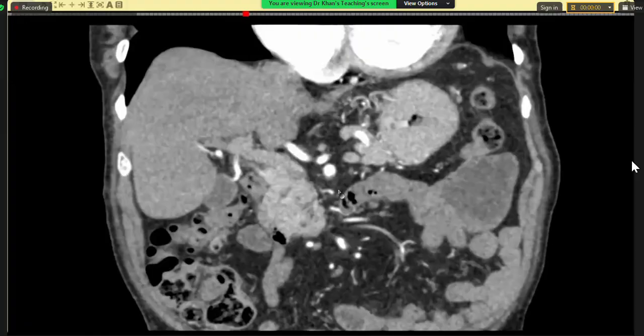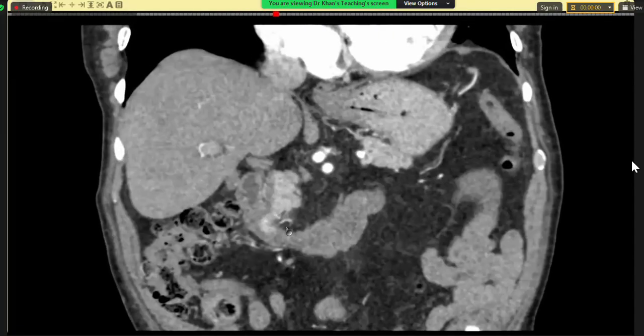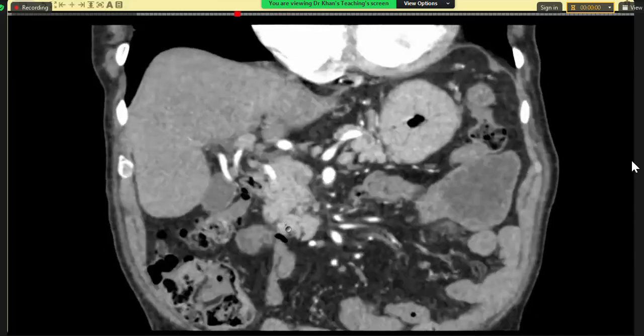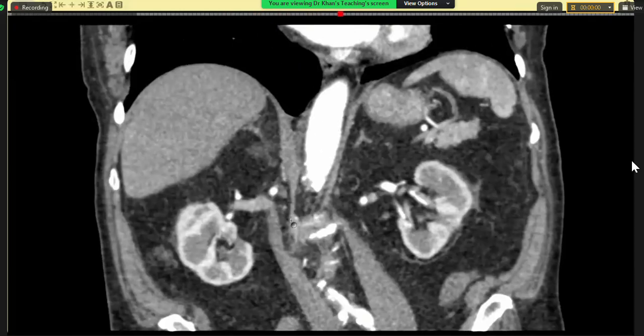So this is the C of the duodenum, and the lesion is sitting outside, inferior and slightly lateral. So this is gastrinoma with rugal thickening. Okay, well done. You picked up the finding very well. You could not just join them together. So well done. Thank you, doctor.